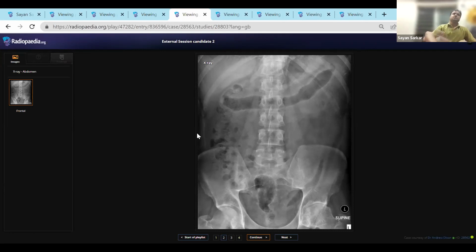That's absolutely fine. So can you just tell me, ignoring the history of inflammatory arthritis, which is your topmost differential and why? I would favor inflammatory colitis in comparison to ischemic because ischemic would more likely go according to a vascular territory, while this is involving the whole transverse and the descending colon. And in my normal clinical practice, I would check serum inflammatory markers. How old do you think this patient is?